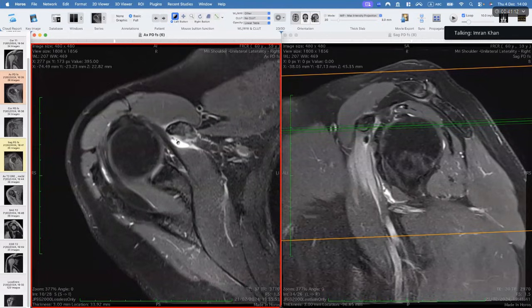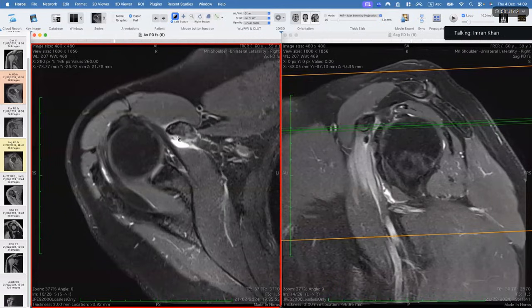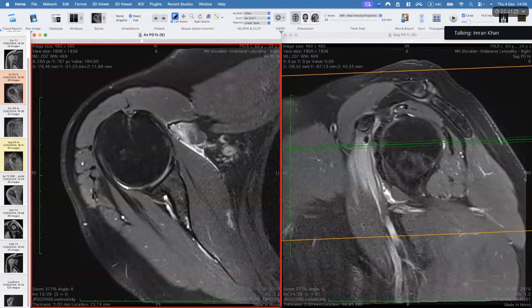We see it particularly on unusual occasions where we ignore it, and it turns out that we shouldn't have. I've seen it in small joints of the thumb, I've seen it here, I've seen it in ankles, and even in pes anserine tendons, literally tiny calcifications, but they can cause a lot of edema and inflammatory changes around them.